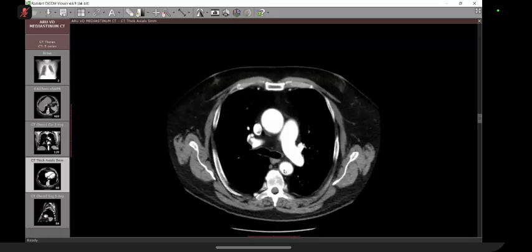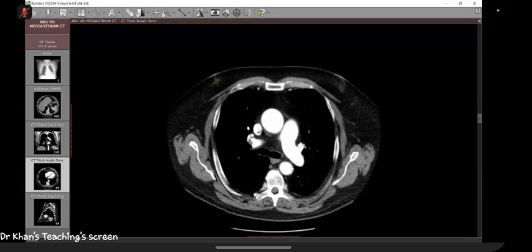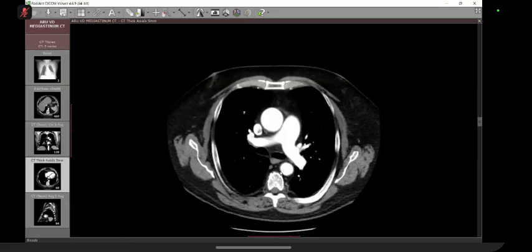Now, this is the left main bronchus, this is the esophagus, this is the azygous vein, this is the descending aorta. A lot of issues are with the aorta. Develop your eyes here, for example. On this slice, this is the descending aorta, this is the esophagus. You can see that there is a fat plane between the esophagus and the descending aorta. When there is a carcinoma and it encases the aorta, we call it a T4 tumor once again. You cannot operate.